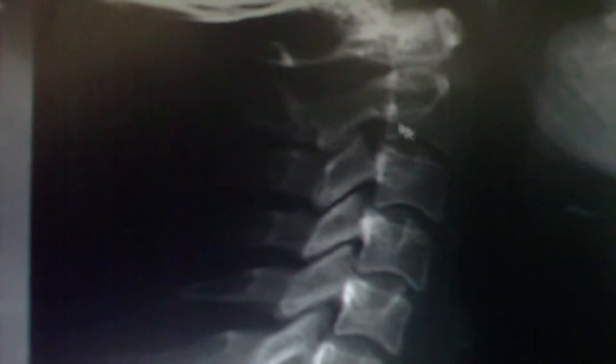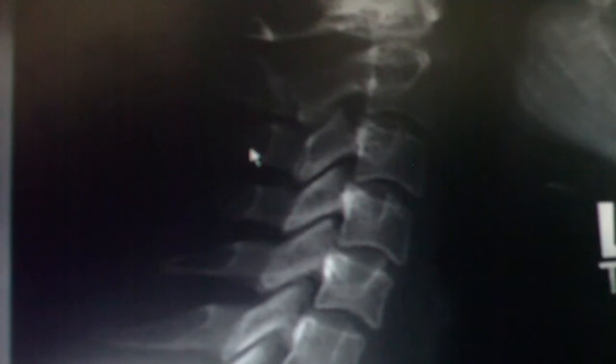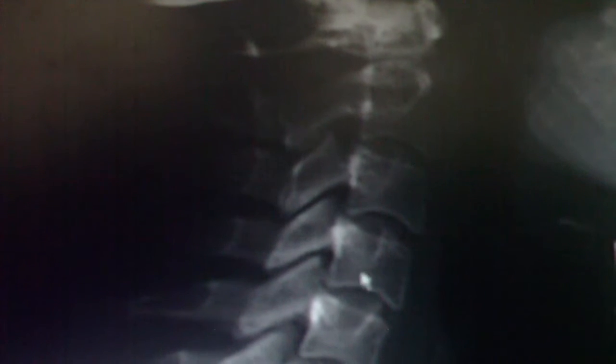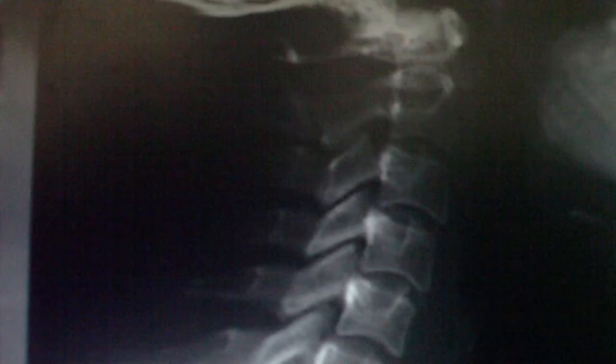Okay, so the pedicle we know attaches all of these posterior elements to the vertebral body. So going from back to front of the typical vertebra, we would have spinous process, spinal laminar junction, lamina, articular pillar, and it's okay to have that little notch, pedicle, and then vertebral body. And remember, the transverse processes come off of the body in the cervical spine, but off of the lamina in the thoracics and the lumbars. Just above where the pars interarticularis is, as we talked about earlier.